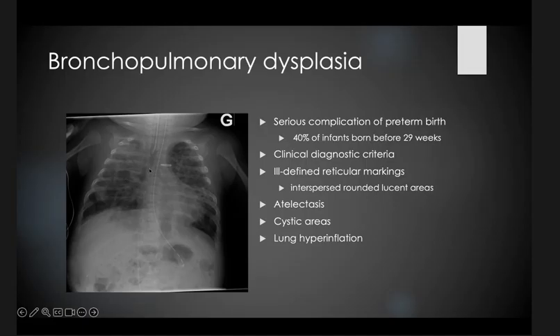In that baby, you can see that he has a clip from a clipped arterial canal. In premature babies the canal can still be open because of the hypoxemia, and they try to close it with non-steroid anti-inflammatories, but sometimes they cannot get it closed. So a couple of those babies need to have heart surgery to close that canal. You can have that thing here, and you see here that they go from a left thoracotomy. So you can see the ribs here are a bit wider.